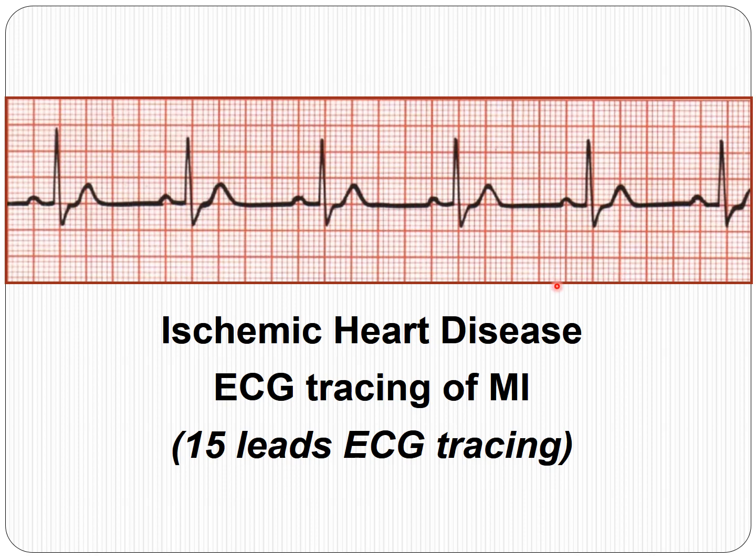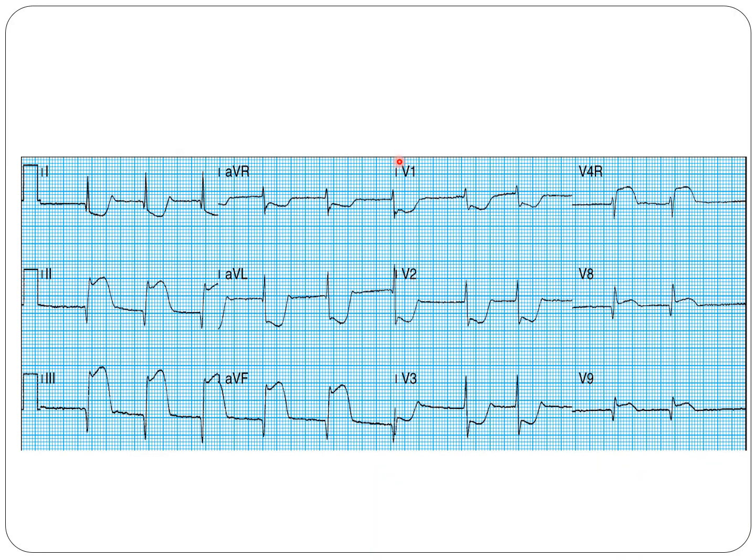The following ECG tracing was taken with a 15-lead ECG. To prove the posterior and right ventricle MI, they are applying V8, V9 for the dorsal leads and V4R. The following tracings are not 12 leads; they are recorded in 15-lead ECG settings. That means that in addition to the 12 leads, we have extra dorsal leads, V8 and V9, and we have a right ventricle lead.